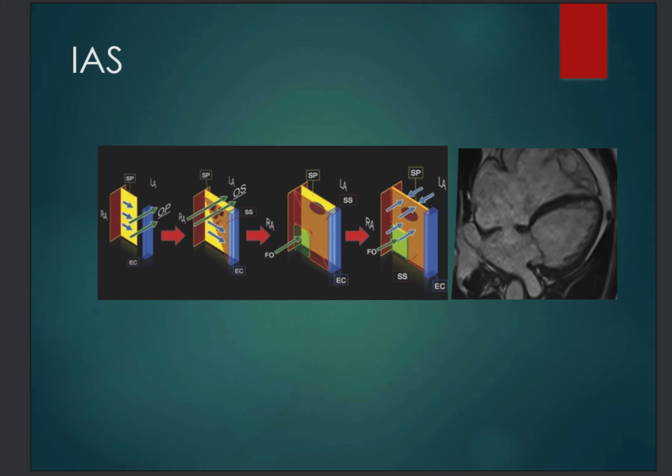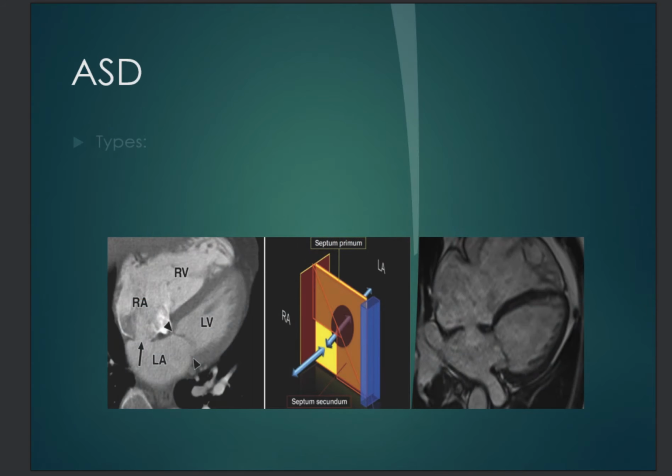Of course, the type and location depends on the development of the septum primum and septum secundum. I'll try, from the cross-sectional imaging and the images, to see where exactly every defect is. Starting with the ASD secundum, it's the most frequent type of the four types of ASDs, sometimes even encountered in elderly patients, accidentally discovered while preparing for another surgery, and the echo then reveals an ASD.